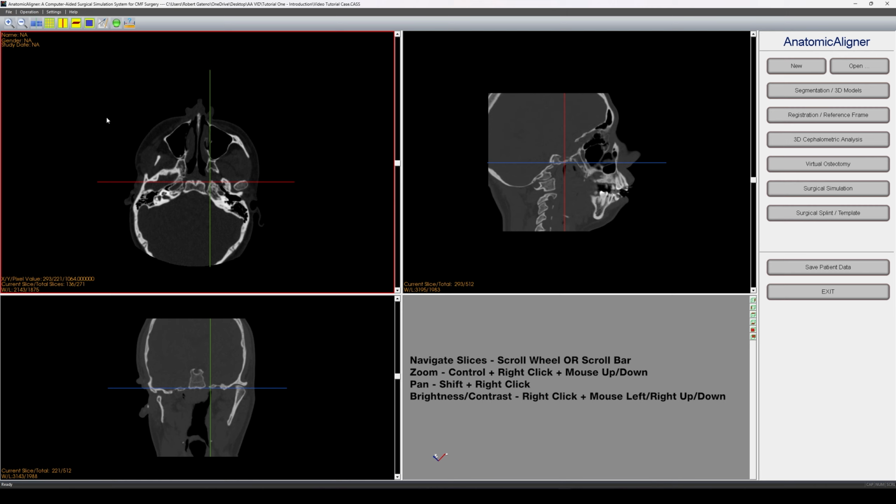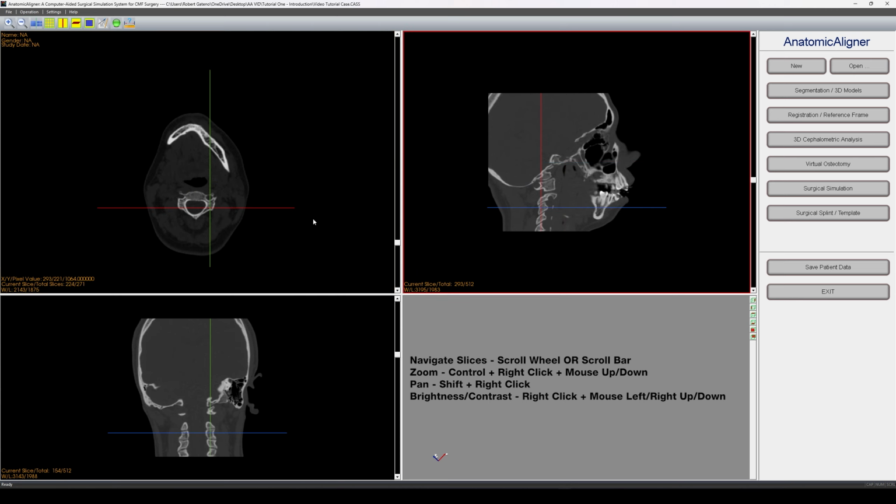In the top left of our axial view, we have the patient's name, their gender, and the study date. In the bottom left, we have the XY pixel value of this crosshair. This creates a 3D composition location of where we currently are using these 3 2D views. So if I was to click in the spine in the sagittal view, it would move our location in the corresponding views. In the bottom left, we see the WL value. That's our current brightness and contrast.